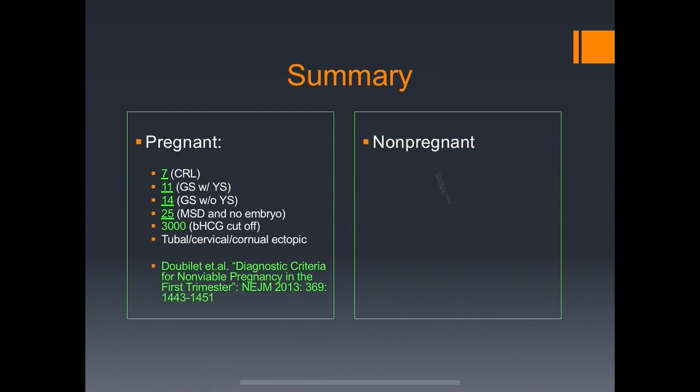In the non-pregnant patient, retained products of conception, differentiating that from clot, which tends to be non-vascular, molar pregnancies, which tend to have a different clinical picture. They're usually not diagnosed after a delivery or a D&C, and then AVMs, which tend to be more myometrial. Torsion is something we don't want to miss.